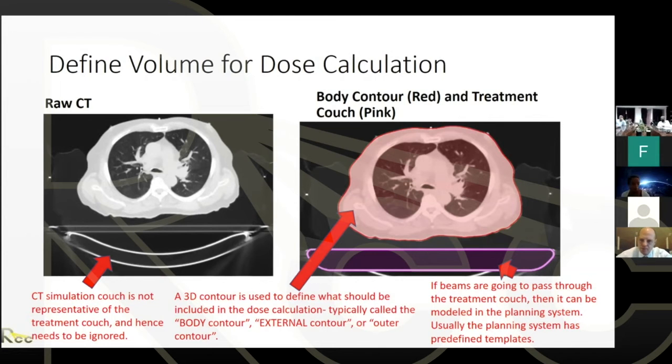And following up on this point, if you have high density metal, sometimes with a prosthesis, you also contour these and assign an electron density given by the manufacturer, correct? Yeah, absolutely. When you have metal like a prosthesis or other metal that's been put in from a surgery, it's a good idea to contour around those and to assign a density to those.